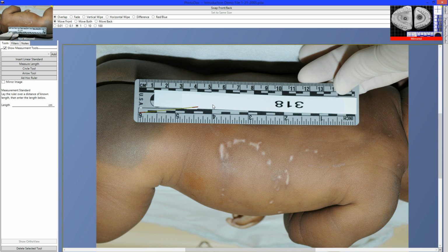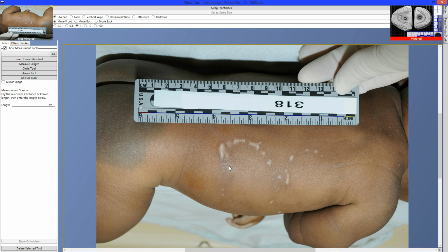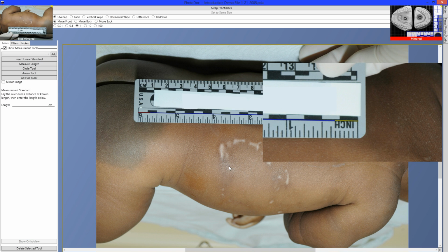So the first feature is that if all you give me is a linear ruler, I will at least play along. You can tell me where your linear ruler is, like that.